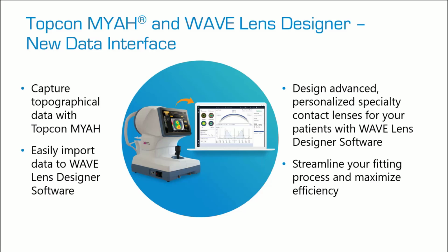And as you'll see in today's webcast, Wave takes topography data from, specifically, we'll be talking about the TopCon MYAH, and brings it straight into the Wave design software. What that means is that you can design advanced, really personalized lenses based on each patient's unique cornea. The end result is really a more efficient process because we're taking fitting sets out of the equation. So that results in less chair time and a level of customization that's really hard to beat.